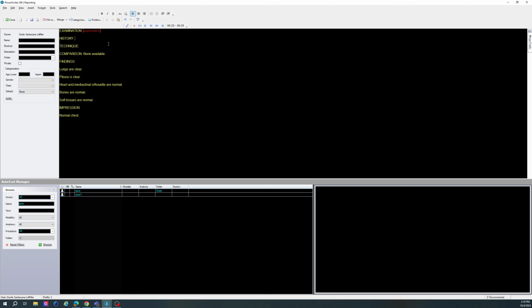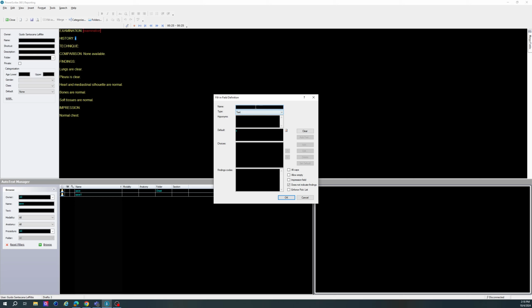So in the history, I really don't know the patient's history, so I can just write X, highlight it as best as I can, and again create the field.